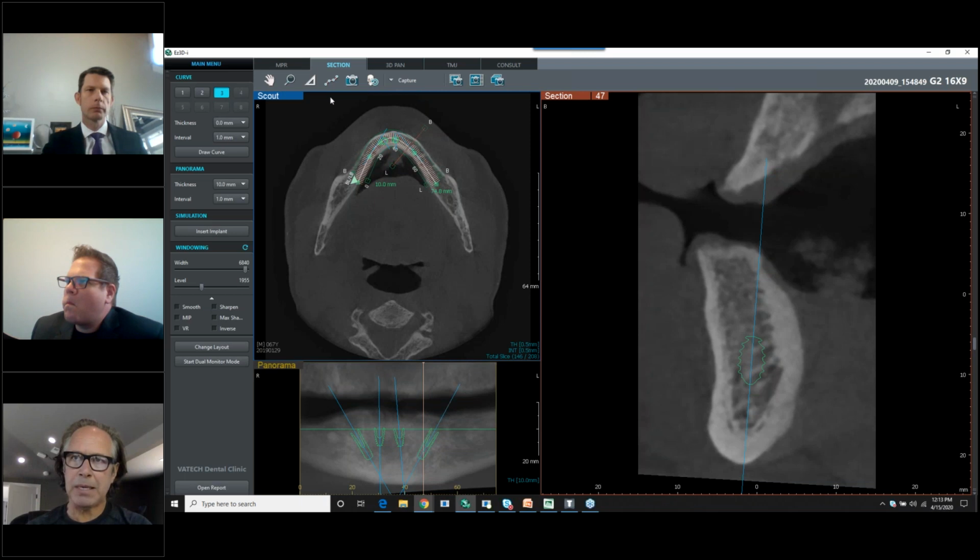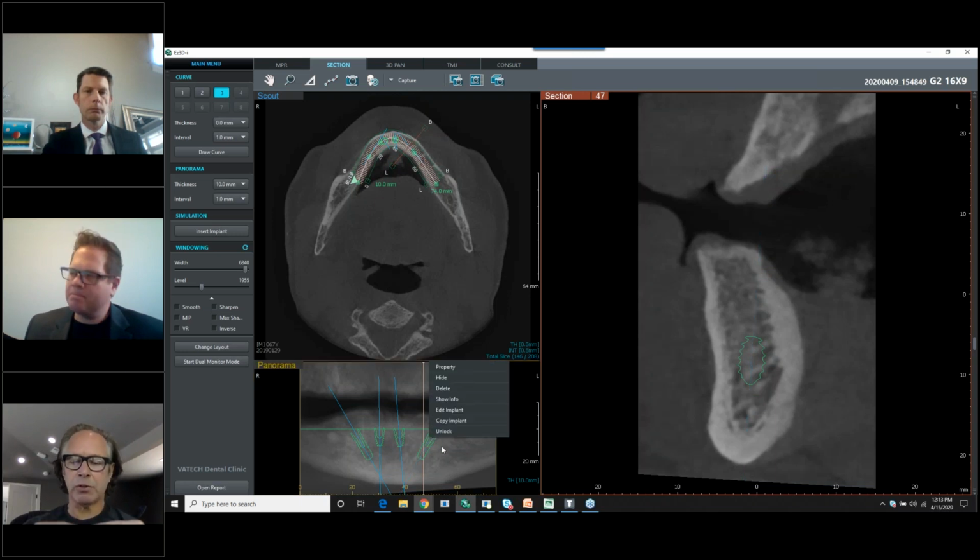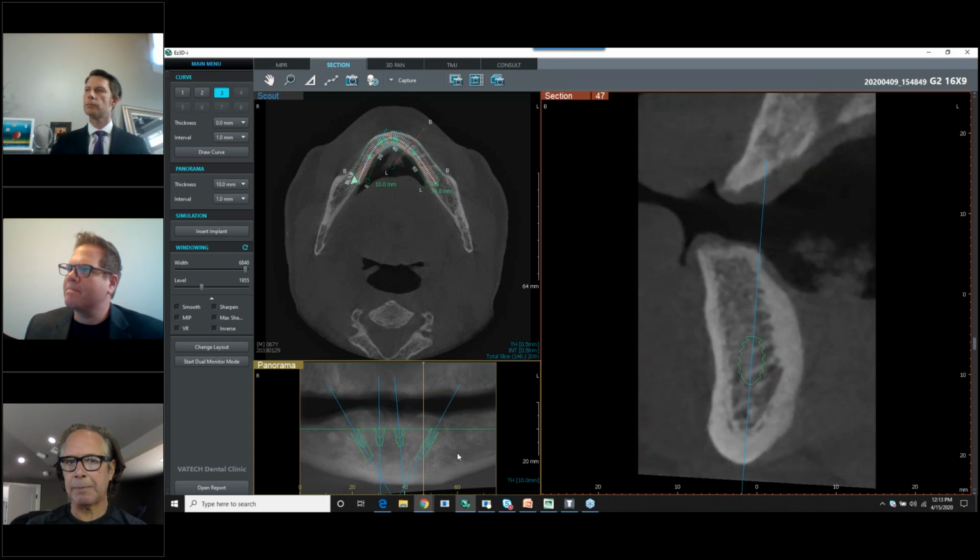So the idea of tipping implants to a certain degree all depends on where the back tooth is. A lot of times you'll see a case where someone puts 4 implants in the lower anterior mandible, very close together, because that's where we have a lot of type 1 good bone. That's great, but if they're very close together on a straight line, the anterior-posterior differentiation is very minimal, in some cases 2 or 3 millimeters. AP spread stands for the anterior posterior distance of where the teeth can go with support.